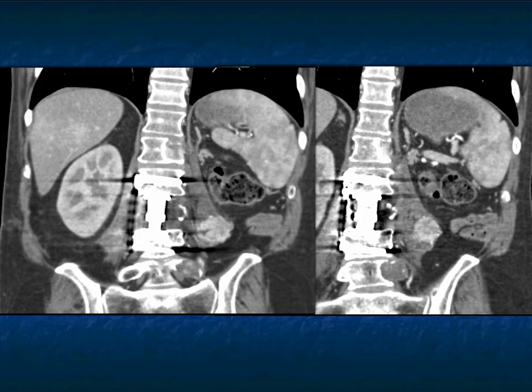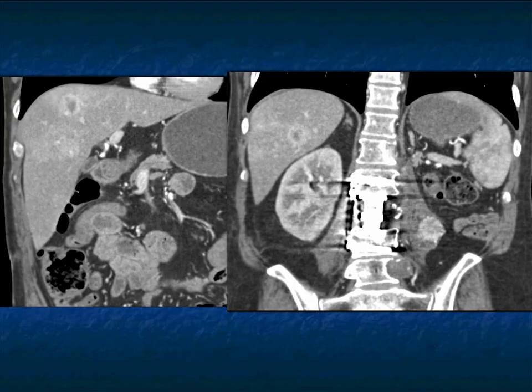And again, just like with the other tumors, these lesions are going to be very vascular when the primary is a clear cell. You also look carefully, the transverse process here at L5 is blown out. There's a large destructive tumor there. So when you have bone mets, you need to look really carefully because one bone met tends to make certain that you have another one. And then you want to look carefully and make sure you're not missing anything. You want to look carefully at the pelvis, bones that are commonly involved, sacrum, iliac bone, and the femurs bilaterally.